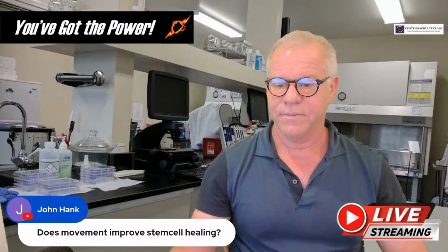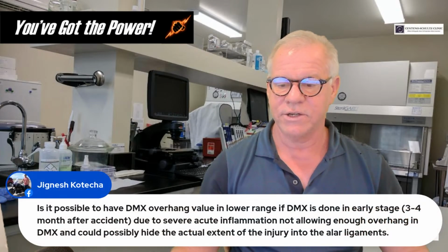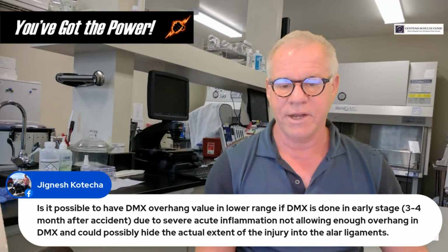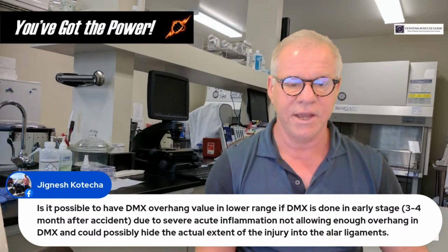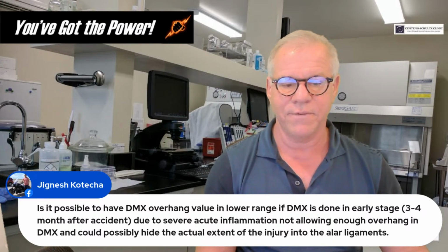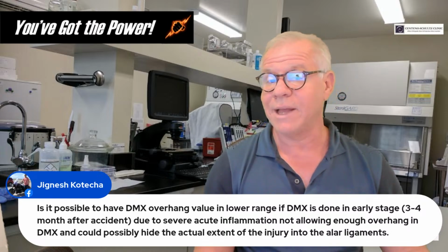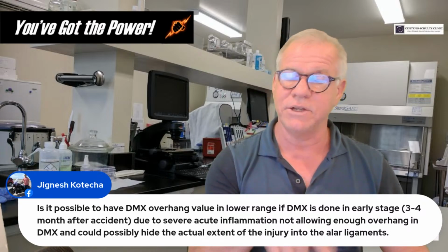Let's see, one more question here. Is it possible to have DMX overhang value in the lower range if DMX is done in the early stage due to severe acute inflammation, not allowing enough overhang? Yeah, I think DMX overhang values can be affected by lots of things, usually not inflammation, but certainly range of motion.